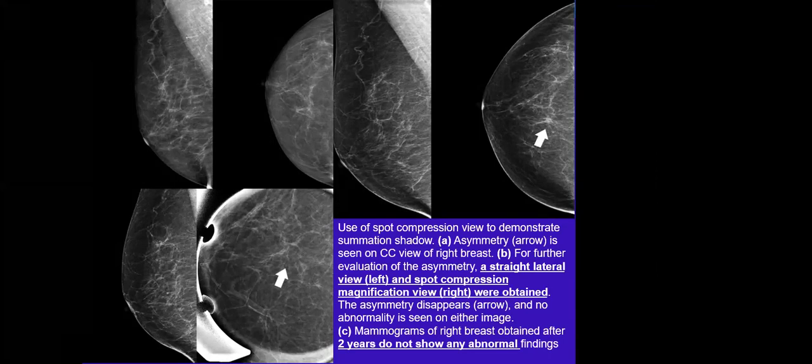This is one criterion. The other thing is the composition of the breast. The location of the lesion makes the possibility of being excluded unlikely. What other issue? This is a fatty breast, so the possibility that it is superimposed by fibroglandular tissue is not there. Excellent, well done. It is a fatty breast, so there is no fibroglandular parenchyma that might obscure this asymmetry in the other projection. Okay, what else?